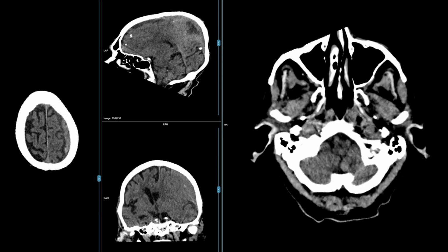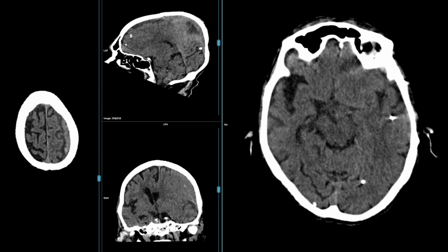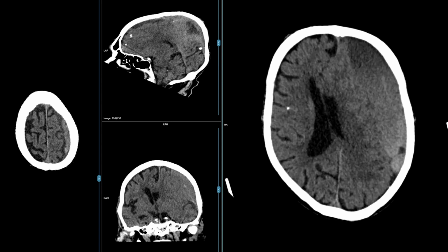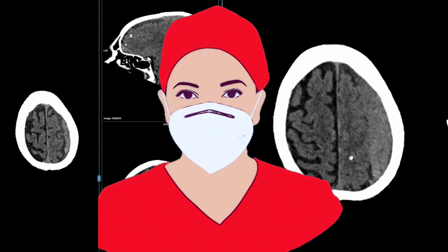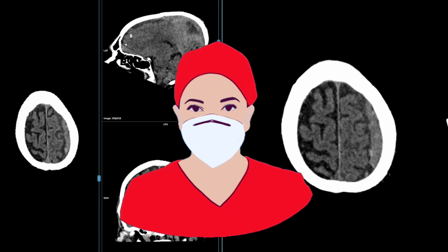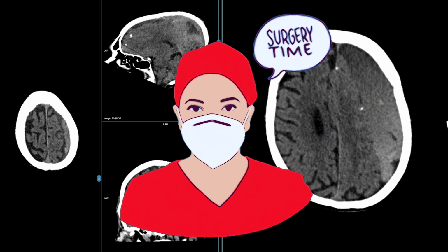These are the most important things to look for on this scan, given the significant abnormality and the effect that it may have in the acute setting. It would be important to notify the neurosurgeons at the time of looking at this scan so that management can be sought in the form of evacuation of this hematoma.